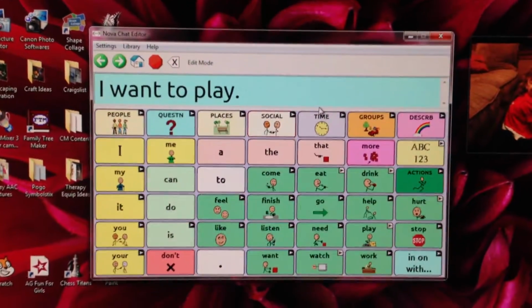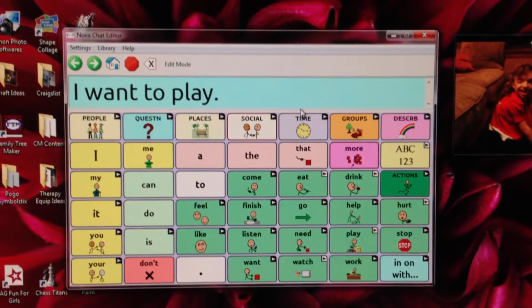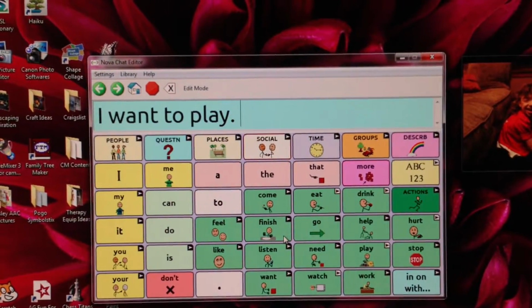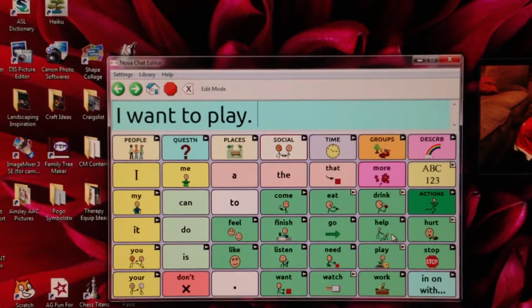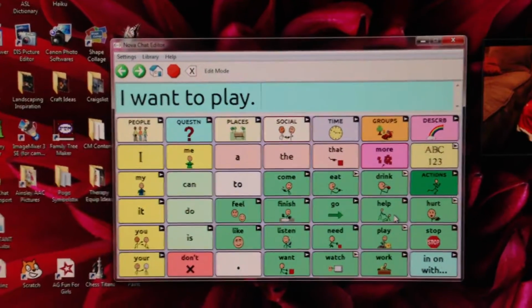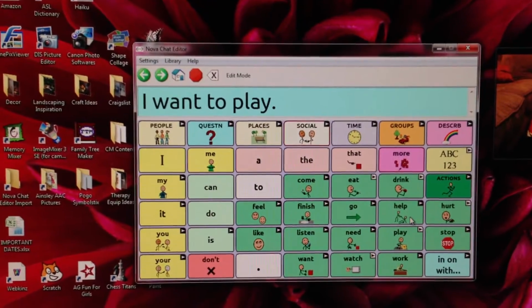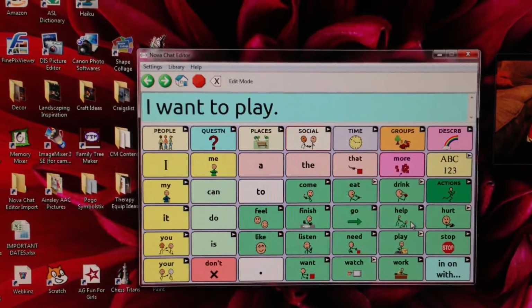So this is a good vocabulary. However, unfortunately, when you look at the buttons, and it's probably difficult to discern this from a cell phone video, these images are actually pretty small, and on a 7-inch device, it's pretty difficult to differentiate one button from another. We did try this at school for a day or two before we ruled this out, because clearly going with a vocabulary that's already done is the best option whenever you can get by with that.